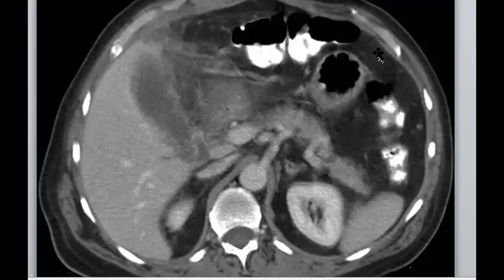It's good to mention that you will search for free air. If you find fluid outside, then you think about cholecystitis with perforation, and also the wall defect. Maybe here. So cholecystitis with perforated gallbladder, nice.